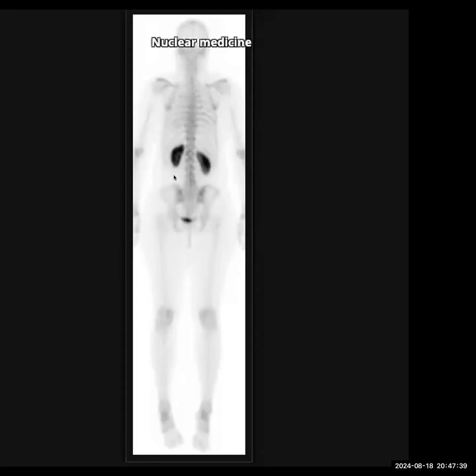In this case, this is called a hot kidney sign. It's a bone scan, and when you're describing any nuclear scan, if you have no idea what you're thrown at, you just describe that this is a nuclear bone scan where I do not see any uptake in the rest of the bones, and I can see diffuse uptake in bilateral kidneys. However, at this point of time, I'm not able to pick up any differentials that could present with this.